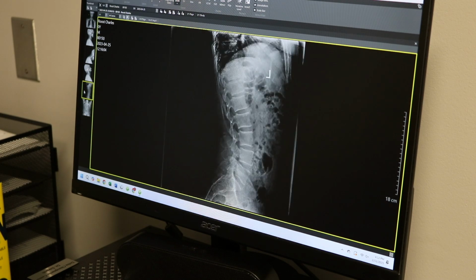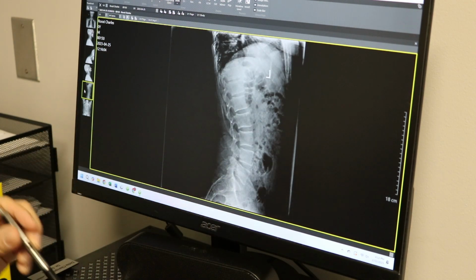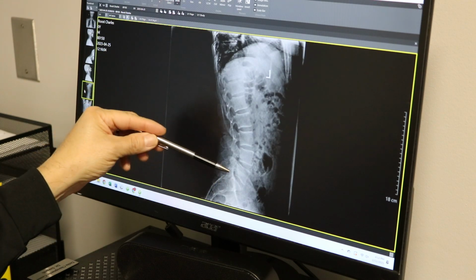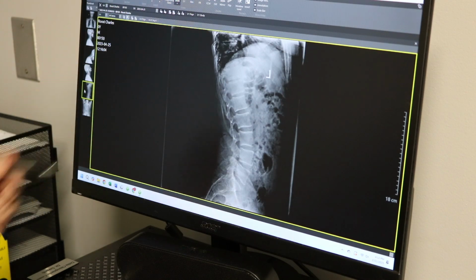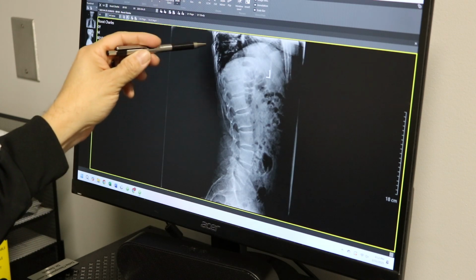All right, let's go to the lateral lumbar. Okay, so the side view, the lateral lumbar here, so you're facing towards the right. So that tailbone that I mentioned earlier is right here, okay? And then we have the 5 vertebrae of the lower part of the back till we get to the bottom part of the rib cage area. What else do you see on there? I see my sternum. Can you point that out? Yeah, right over here. Okay. Can we see ribs? Yep, bottom part of the ribs are running right through here like so, okay?